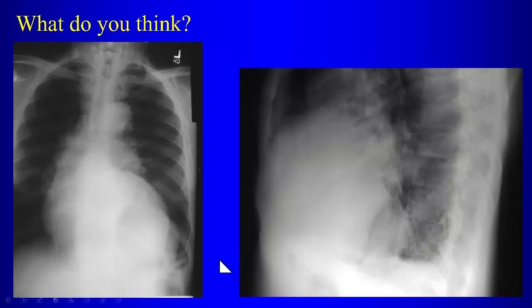Okay, and then you see it on the lateral view? So this area of bulging here, do you see it on the lateral view? Well, yeah, the left atrium's up here though, but this region of bulging, where's that region of bulging? No, it's back here. See it?